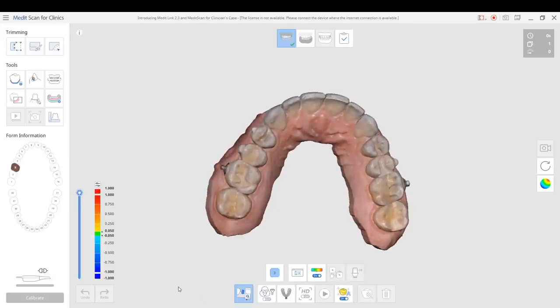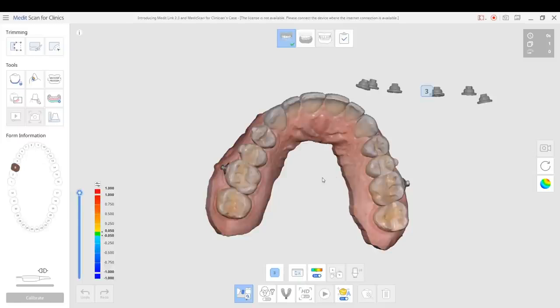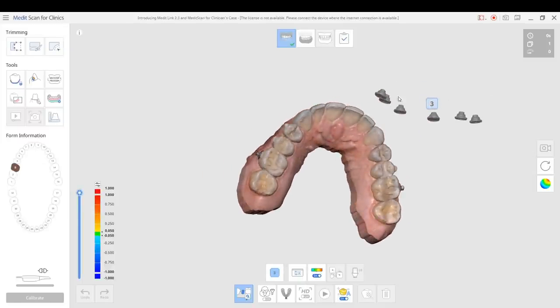Next thing I'm going to show you is this button down here. When I click on this, we have the opportunity to bring in pre-formatted STL files or 3D models of implant superstructures. Now, advanced users will actually take advantage of this and bring in things beyond anything that deals with implants. Like you can bring in an STL of a CT scan, you can bring in pre-ops, but it's another way to incorporate other STLs. Here I just have a simple 6-unit multi-unit abutment model from a photogrammetry program that we've brought in that you would click on, and now when you scan, you can try and merge these things live.